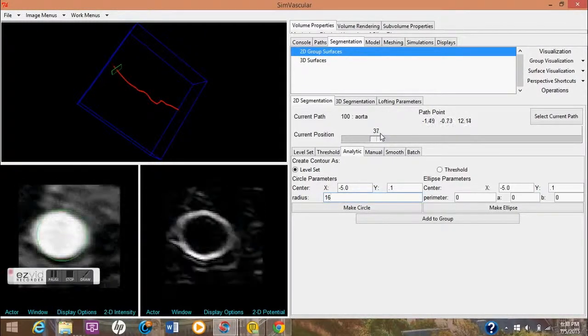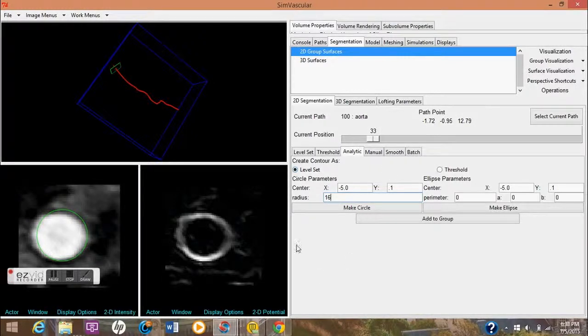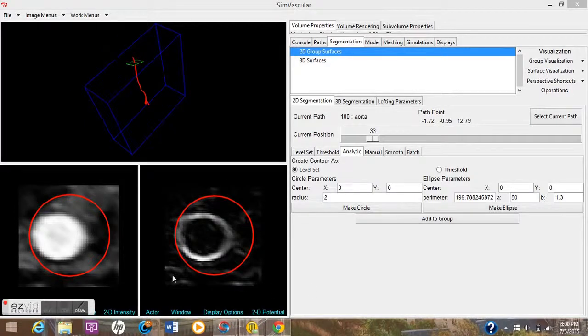I'm playing with it. So this now, I have a fix for that. Usually when you close the path in the last part, it'll create a closed path. I got a fix for that later in this. So this is how to make a circle or make an ellipse. So there they are. That's make circle, radius of 2.